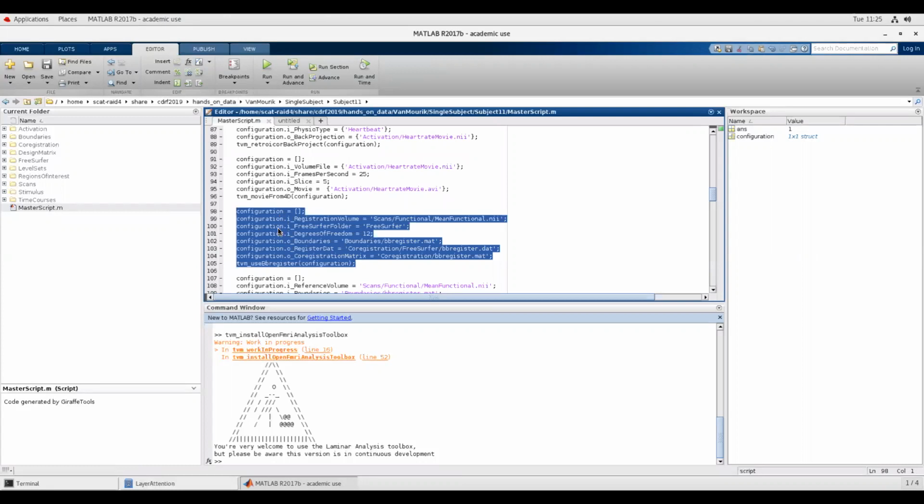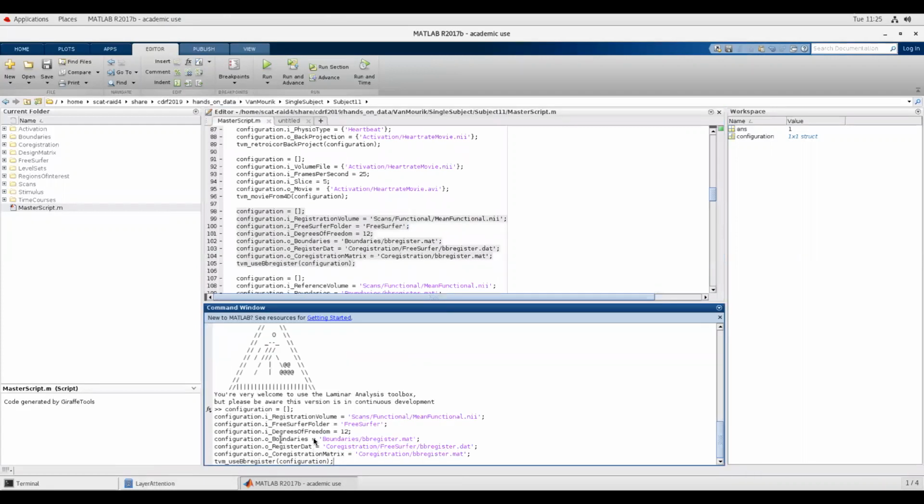Anyway, we can also just drag it into the editor. Maybe that's easier. Yeah, that works. Okay, so this is just when I was writing this toolbox, I definitely reinvented some wheels, but I didn't reinvent every wheel. So I wanted to be able to implement my own things in MATLAB, but also to be able to run things from other packages that other people developed before.